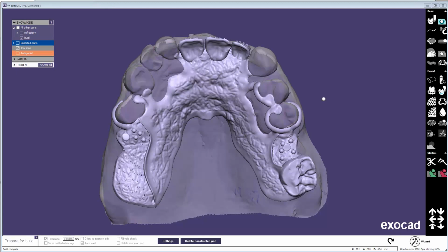Hi, I have an interesting case here that has several fit issues, and so I think it would be interesting to go over why that is happening and how to work around it, and also just not do certain things that are causing some trouble here.